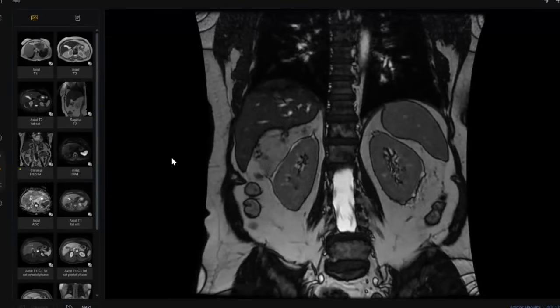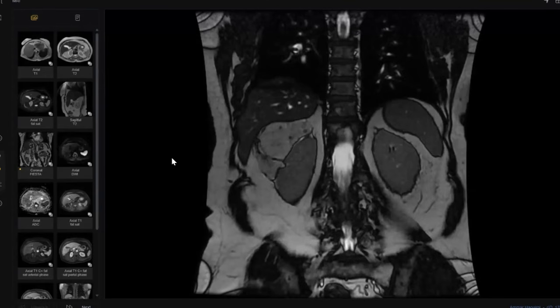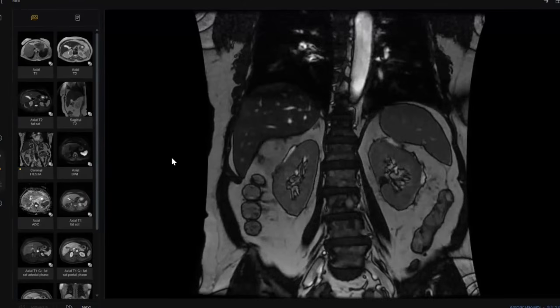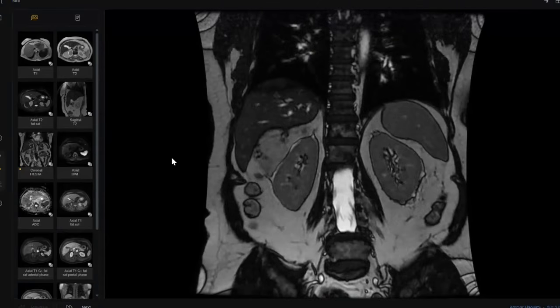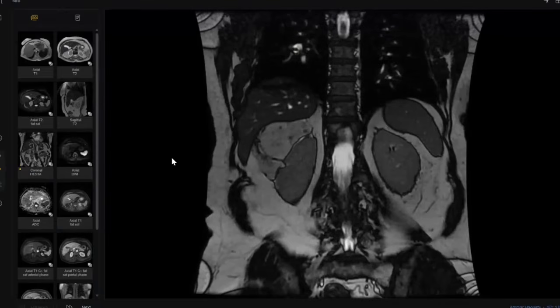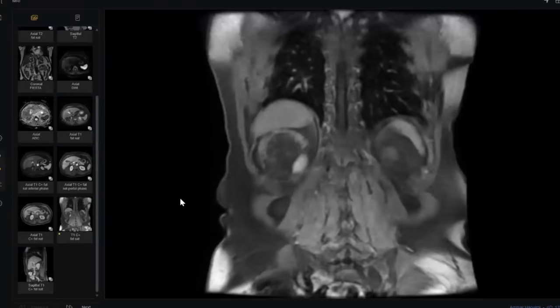It might be an exophytic angiomyolipoma, and I can appreciate it has slight infiltration into the upper pole of the right kidney. So it might be an AML, angiomyolipoma. It has a slight nipple-like protrusion into the renal parenchyma at the mid pole as well. So I would like to retract my statement, and I would like to go for the angiomyolipoma of the right kidney with predominant exophytic bulk, and hyperintensity was appreciated.